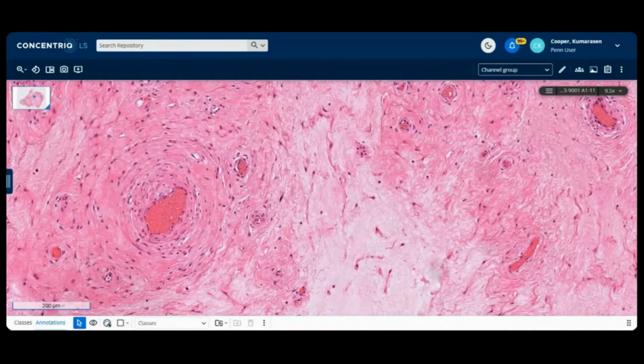That's a very good thought. In truth, some of these areas that we see here, I hope you can still see this field, would pass with that, and you get blood vessels as well. It's usually very hypocellular. When you look at it, it's so bland, and you can sometimes get bands of smooth muscle traversing the tumor. So that's a good thought.